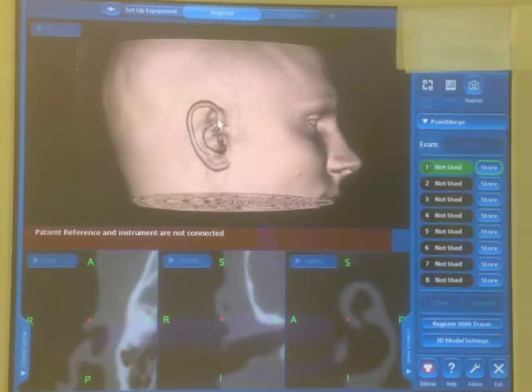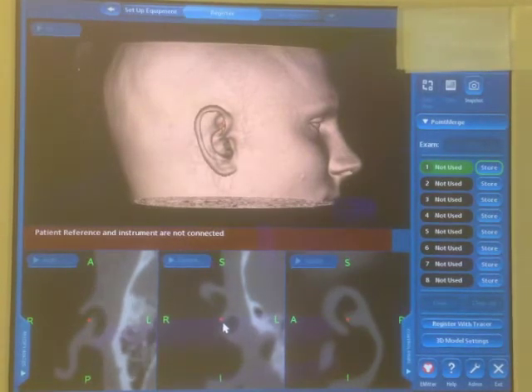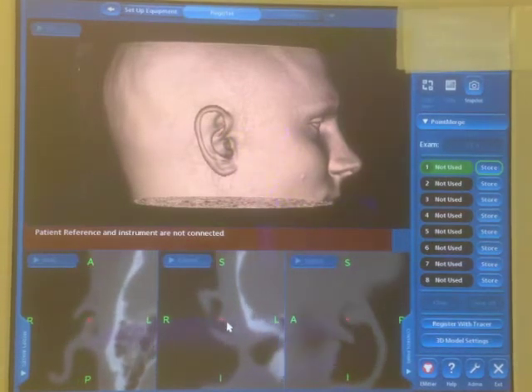So at this point we're going to go through and show you how I select points. The first point we're going to do is the juncture of the antihelix and the helix, so the inferior crus of the antihelix. So here's your antihelix going up as an inferior and superior crus. You do the inferior crus where it connects up with the helix. And these are important because it's very, very difficult to get landmarks on the face that correlate between CT scans and actual physical findings that you can point out with image guidance.